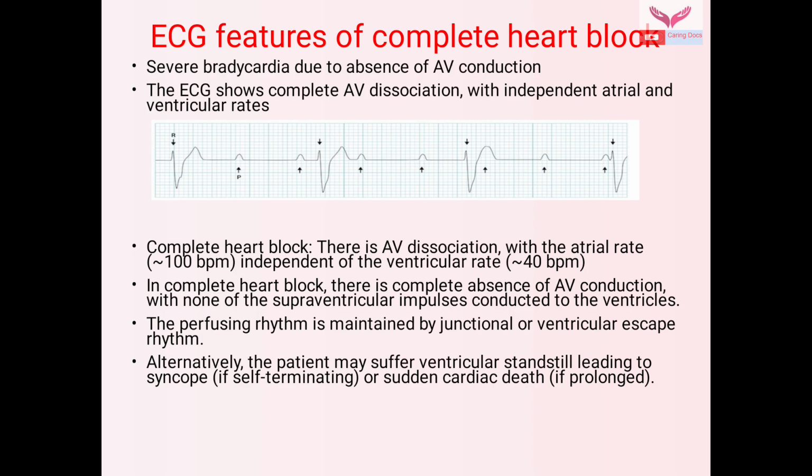The perfusing rhythm is maintained by junctional or ventricular escape rhythm. In this, the patient may suffer ventricular standstill, which may lead to syncope if it self-terminates, or sudden cardiac death if it is prolonged.